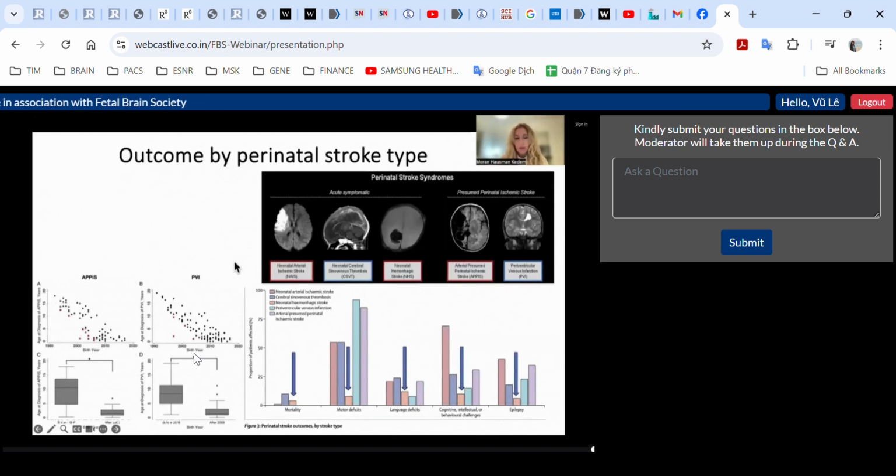You can see here all the blue arrows, and they have better prognosis on all subscales. But this is probably due to the different distribution of hemorrhage location, being more commonly extra-axial in term infants than IVH, as we usually see in preterm as well as in fetuses.